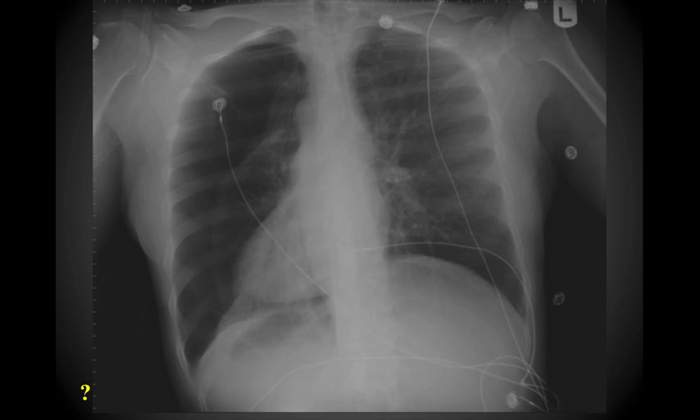And here's another one. Take just a moment to look at this one. Hopefully in this one, once again, you notice that there's still a pneumothorax, so you can see the absence of lung lines, but hopefully you also picked up on the fact that the mediastinum doesn't look like it normally would. Normally you'd expect the apex of the heart to be on the left side, but instead it's on the right. You'll also notice that there's a gas bubble right below the right hemidiaphragm, so this indicates that this person has situs inversus. That's where all of your internal organs are shifted from their normal side to the contralateral side. So the heart is on the right side of the chest rather than the left.